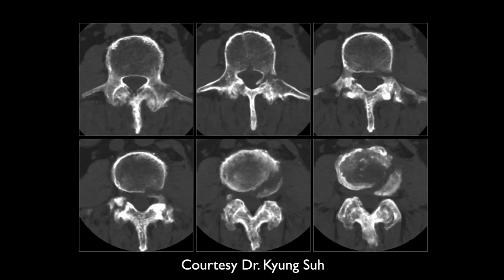All right, 51 male with trauma. Looks like he does have syndesmophytes and a fracture at the four. So one of the big risks in this disease is a fracture. You get osteoporosis because you're not really using the spine much, the bones much anymore. You've decreased activity, and then you've got this long, rigid rod, so you can get high levels of torque on a long rod if you fall, and so you can get a fracture.